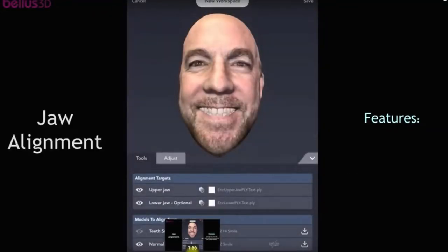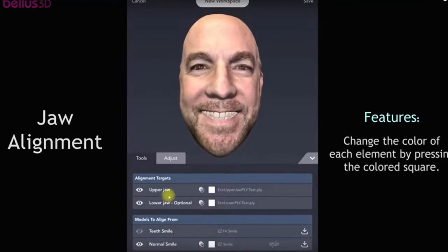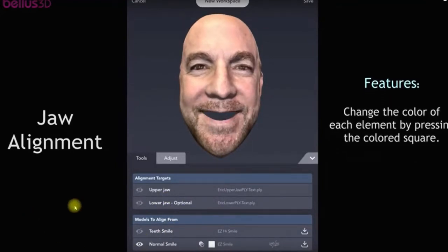Up the faces for you. There's some little moves here. I'm going to pause it really quick. These different things you click on will make either the teeth disappear or show. So you have to go cut the teeth out of one of these, and I want you to say, I call that cheesy hole. It's a cheesy smile with a hole in it, the one where the teeth are cut out of it.